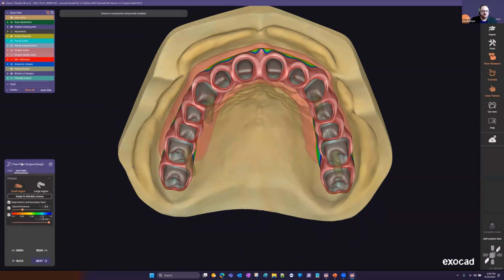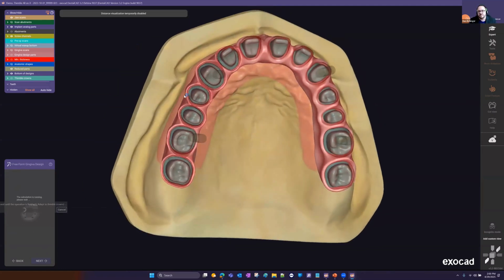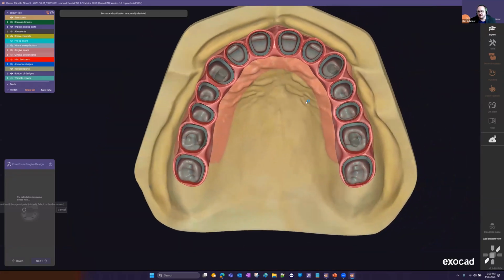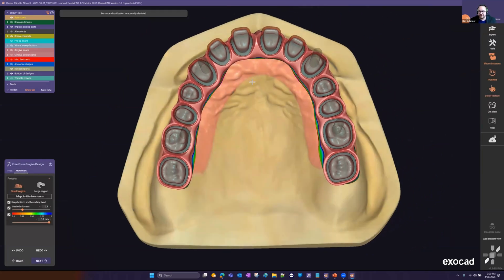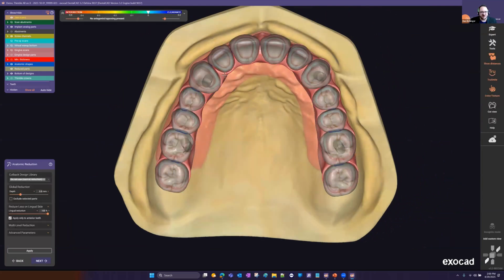We have freeform gingiva design now. So you see this button, adapt to thimble crowns. If you didn't reduce the gingiva, you'd also see that option there as well. But basically the software is automatically relieving the gingival tissue around your thimble prep, so you can actually seat your crowns. If I had just hit next without doing this, the software would have had a pop-up to remind me, do you want to adapt your tissue to your thimbles? So it's good to have that fail-safe in there.